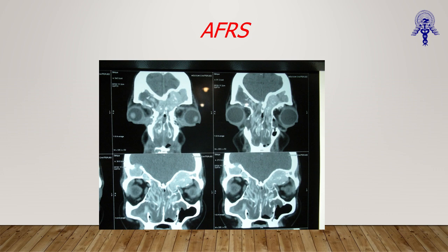What else is there? On the left side it's orbital. So the floor of the frontal sinus on the left side is compressed to the orbit.